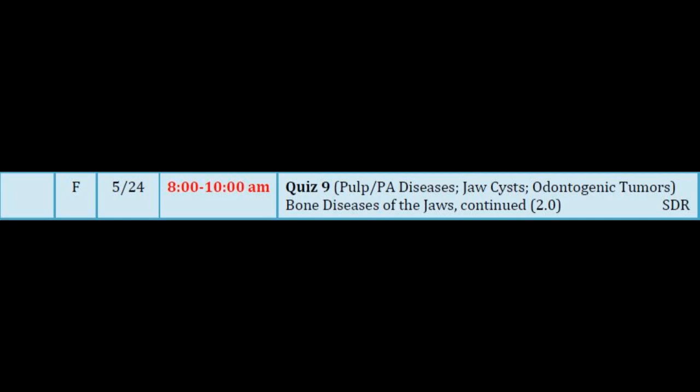The other thing I want you to see is how round this is, like a golf ball. Round, round, round, round, round. Equal distance this way as that way. That is also strongly indicative of a lesion of bony origin. What did you learn about most of the odontogenic lesions? They are bigger this way than they are this way. They never have as much buccolingual dimension as they do mesial and distal. That is a distinctly odontogenic characteristic. So when we see something that's perfectly round three-dimensionally, like a golf ball, that fits with a neoplasm of bony origin, not odontogenic origin. So that's why I like this case, because that demonstrates it so beautifully.